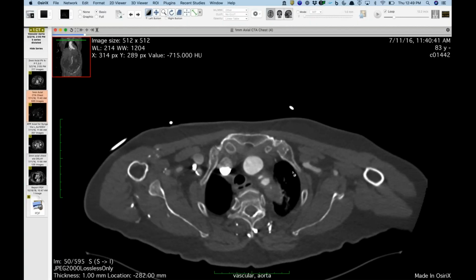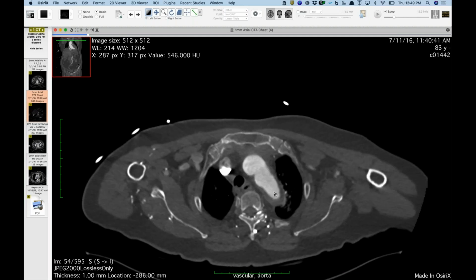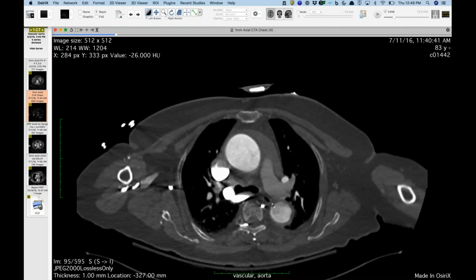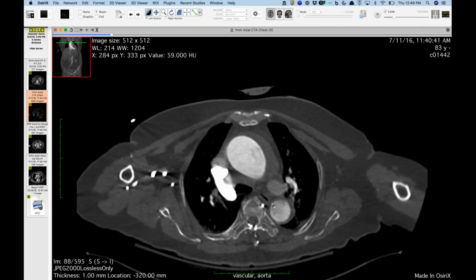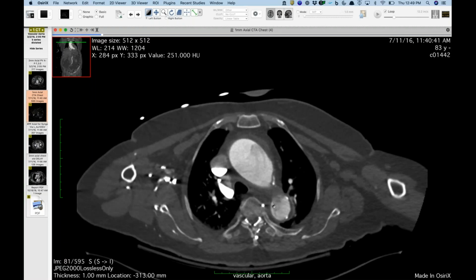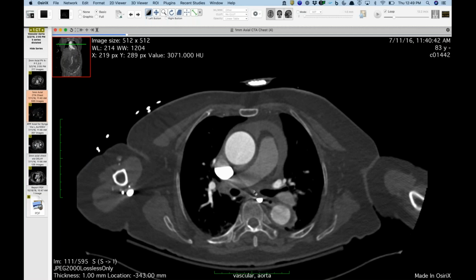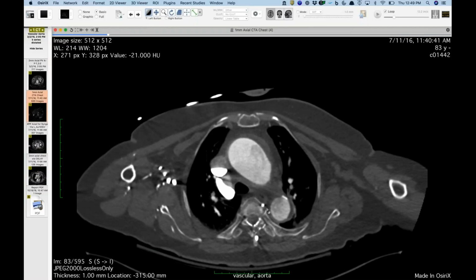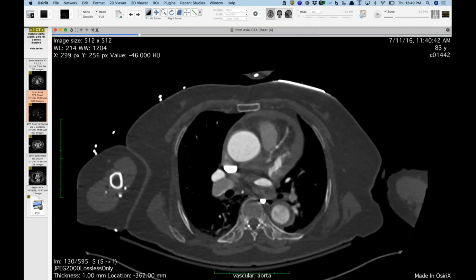Well, they were saying there was something in here, and I don't know if the little ulcer then tracked down along the ligamentum. I don't know. I couldn't find a way to explain why there was hemopericardium, and nor could they. Right. And their note was a little cryptic because their preoperative diagnosis was type A dissection, and it was only when I talked to the surgery fellow offline that they said, yeah, there was no dissection. Okay. But the patient needed to go to surgery anyway to get this evacuated and explored.